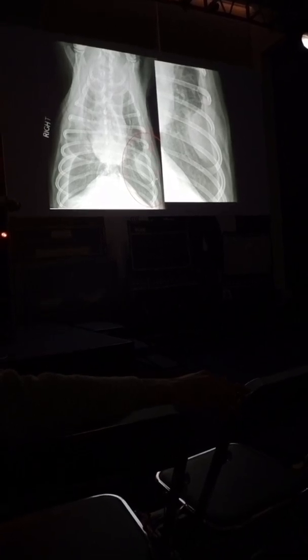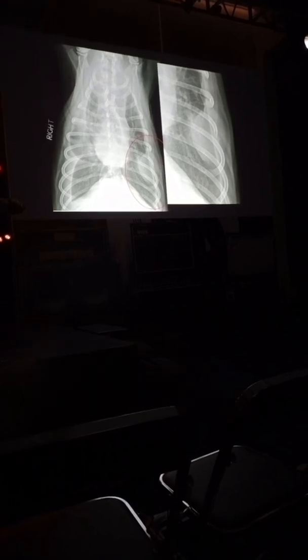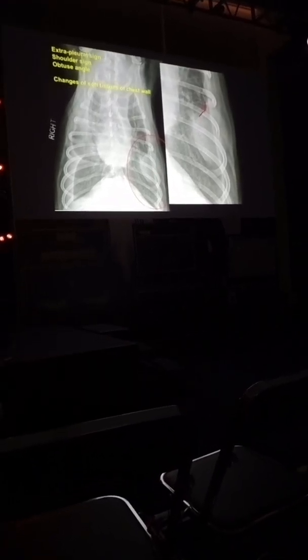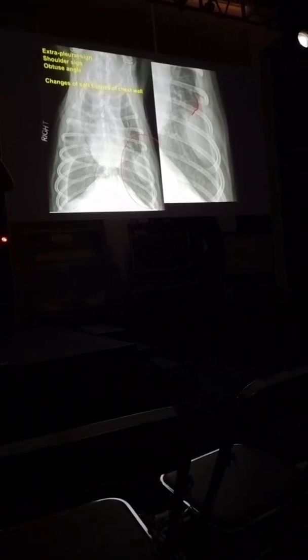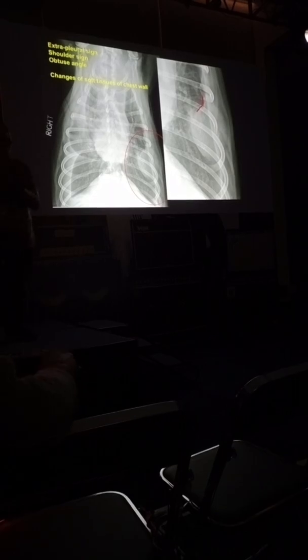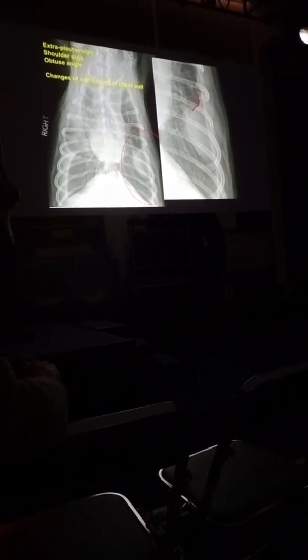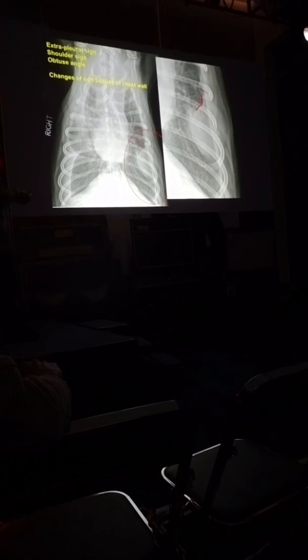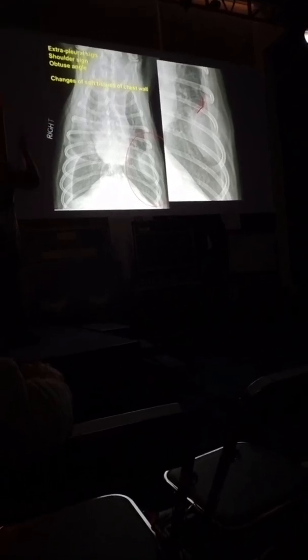Look how it's bulging right there. See the soft tissue here? And the other thing I talked about the other day is when we have an extrapleural lesion. In other words, extrapleural, usually that's of the chest wall or the diaphragm. Instead of being an acute angle, it's an obtuse angle. See how you've got that little bit of an angle that comes away from the chest wall.